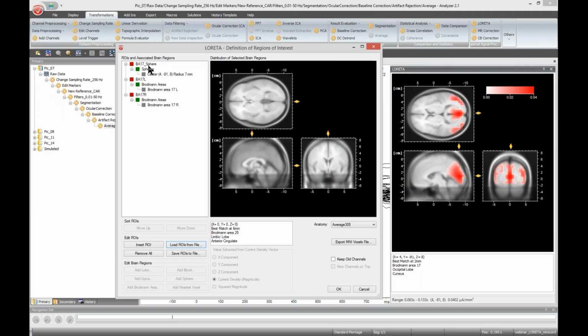The first ROI is to represent a single voxel that sits in the vicinity of the strongest activation, so within this occipital lobe. So I try to create a single voxel, which is restricted by a sphere. And to do that, what I did was I placed a sphere centered at 4, -81, and 8.